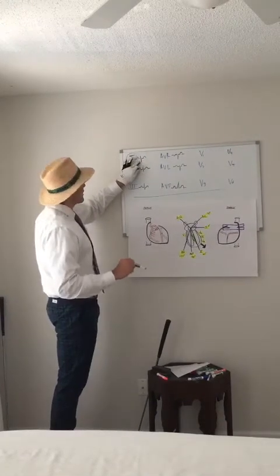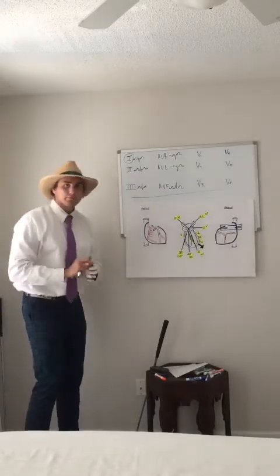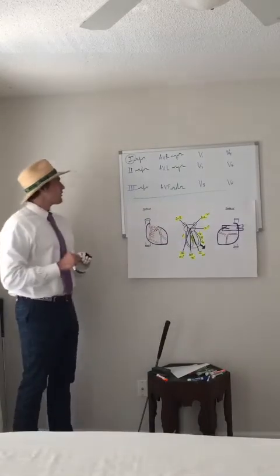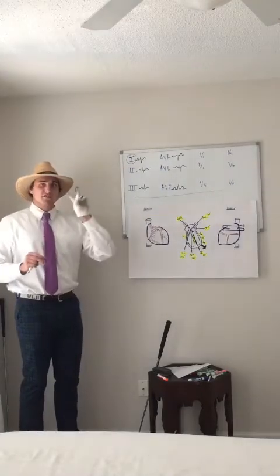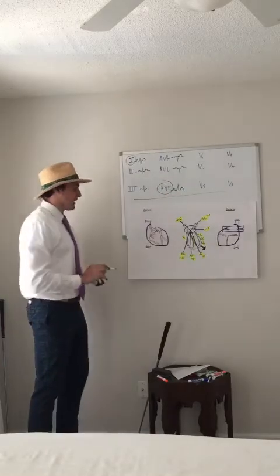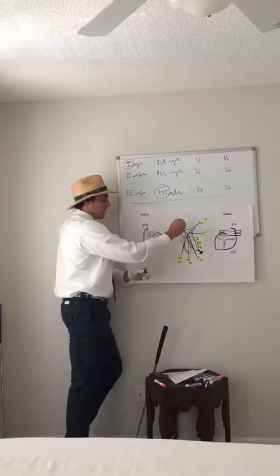All right, we go. Okay, lead 1 is isoelectric. We know that means the eyeball is looking perpendicular; it's seeing it from a perpendicular angle. So we come over and we end up in AVF, which is always the second lead you look at to calculate the axis. We see AVF is upright, so we know by default that it has to be going towards AVF.